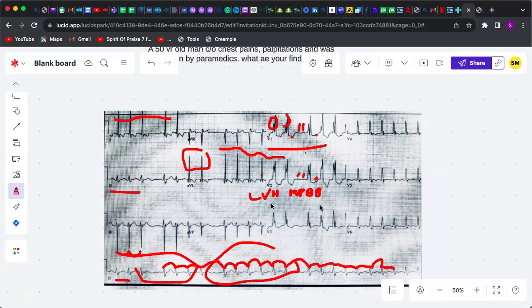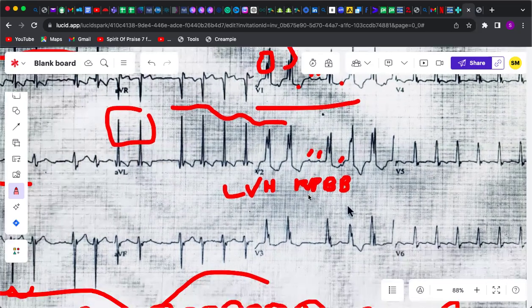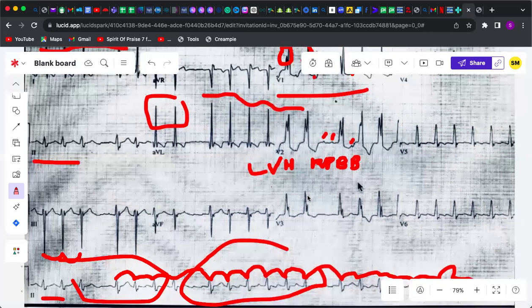Okay. So actually in atrial flutter, the AV node will conduct impulses to the ventricles at different rates. Could be 2:1, could be 3:1, 4:1, or really 1:1. So you should just bear that in mind. And then you know that the P waves or the flutter waves would have a sawtooth appearance like I showed you. So this is more like sawtoothed, right? You can see that. It's very obvious to pick it up.